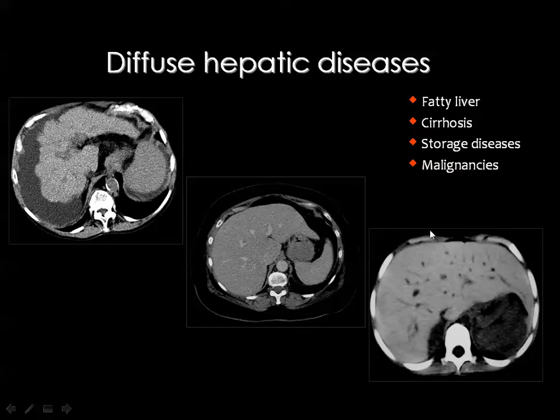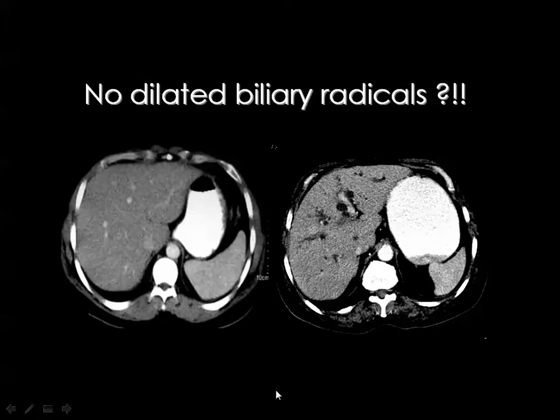Then in the liver parenchyma, you should not see any hypodense lines or tubes or shadows. You can only see hyperdense structures which represent the vessels containing the injected contrast media.